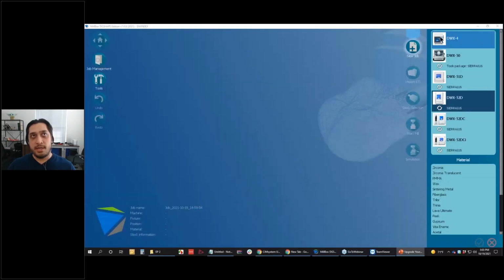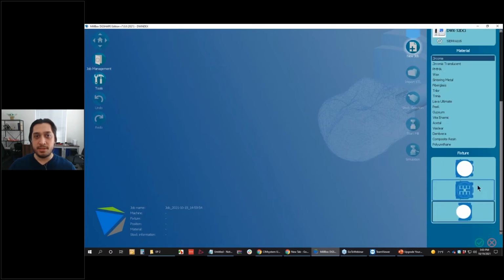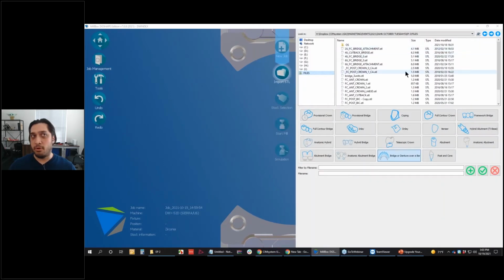So now that we've talked about that, let's go straight into the software, and then we can start talking about these features. So first up is the queued import of our restorations. I'm just going to open up a job for a 52D machine, and we'll use the C clamp. It doesn't really matter for this. And at this stage is where I can go ahead and import files.